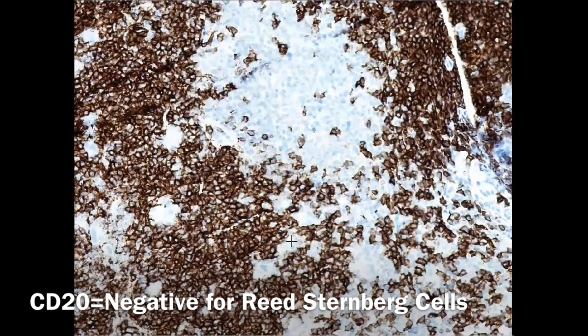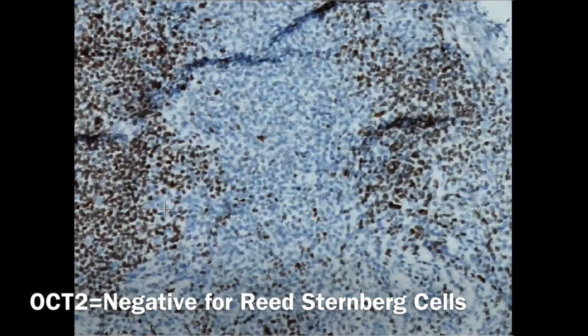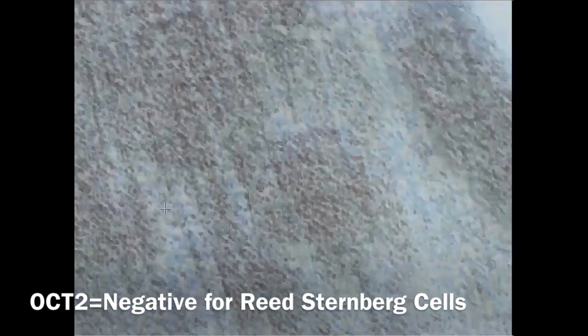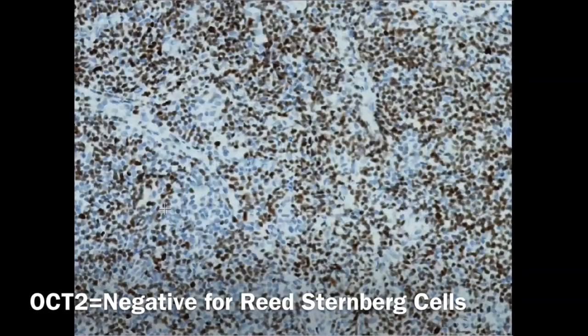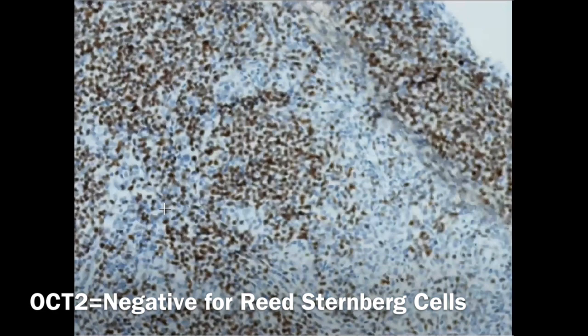Accordingly, this is another big cell not taking the stain. And these cells will lose the transcription factor, the OCT2. So again, we do not expect these cells to be stained with the OCT2. I'll show you some cells here. So all these stained cells, these are B cells. But again, let's see this area and focus on this area.